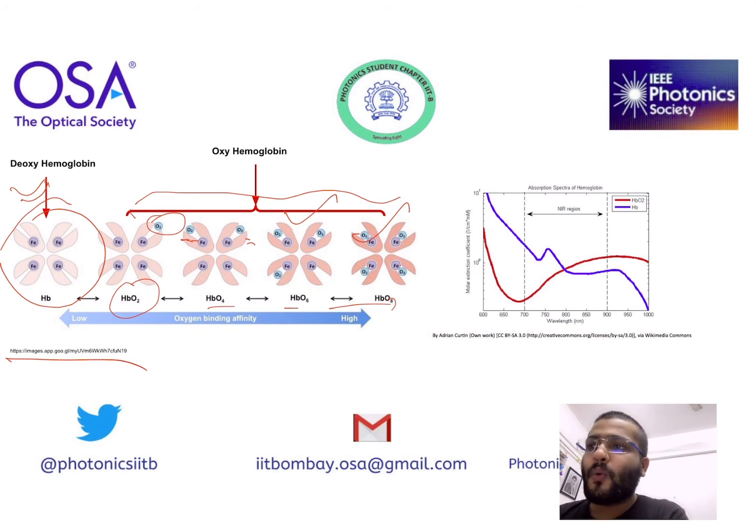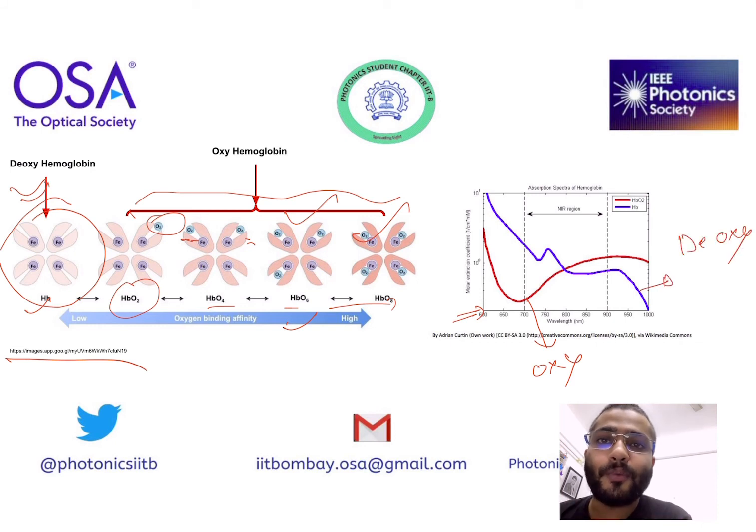Now, what are deoxyhemoglobin and oxyhemoglobin, and how does this device measure them? You can see a graph, the absorption curve, where the red one is for oxyhemoglobin and the blue one is for deoxyhemoglobin.